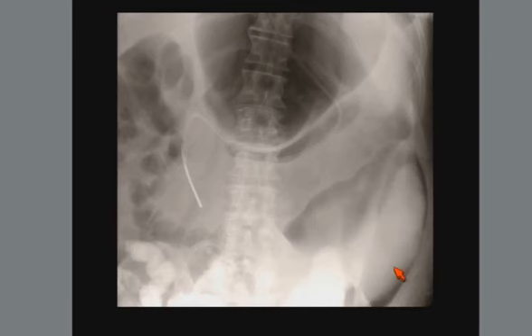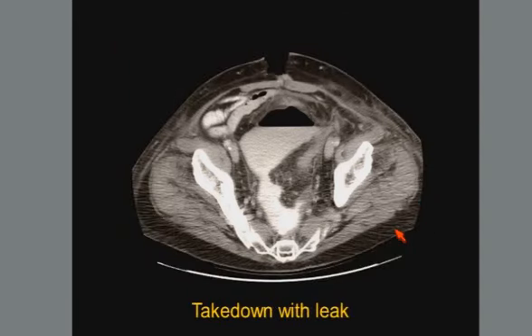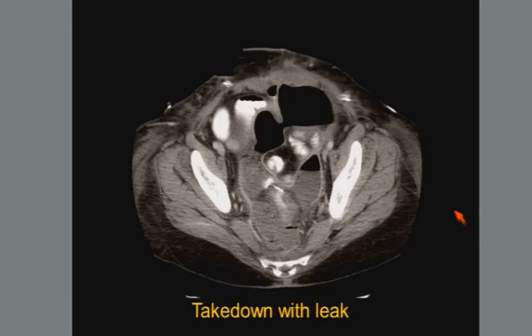This is a serendipitous examination, KUB, after a fluoro examination. You see contrast spilling all throughout the peritoneal cavity. But the majority of the imaging we do looks like this. Here's a patient who had oral contrast, and you can see a frank anastomotic leak in an anatomic structure that doesn't exist. So this is just a fluid cavity that the patient has extravasated into.